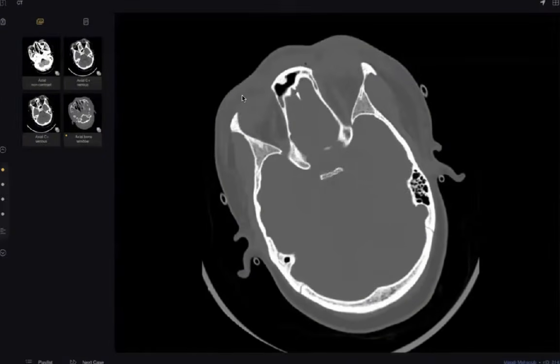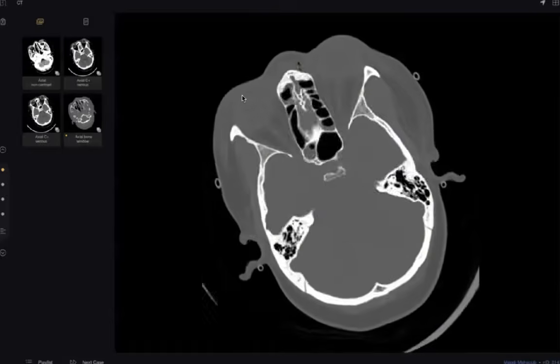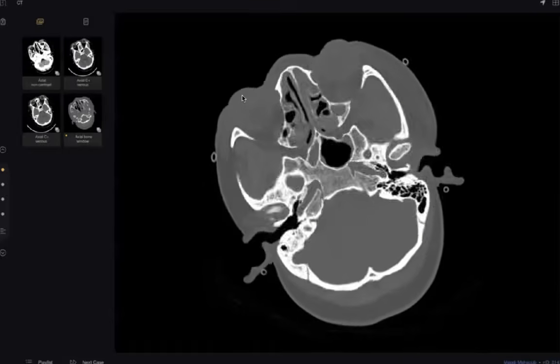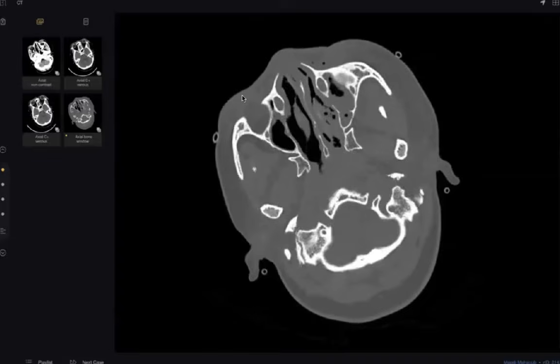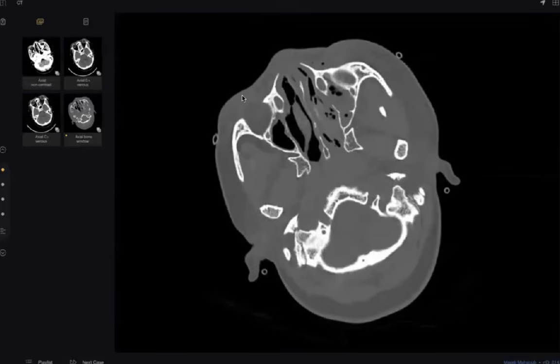Again, extensive sinusitis of both ethmoid and right sphenoid and minimal left sphenoid mucosal thickening. The right maxillary antrum also shows mild mucosal thickening. The left maxillary antrum shows bone erosion and thinning. The left nasal cavity is also opacified. There is no hyperdense lesion foci within this mucosal thickening.